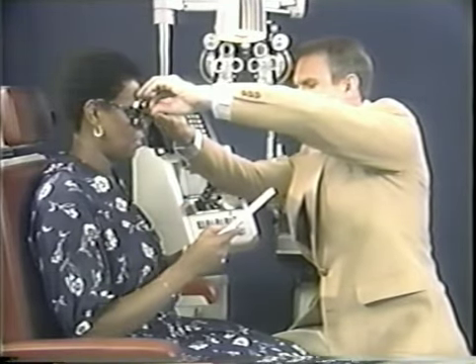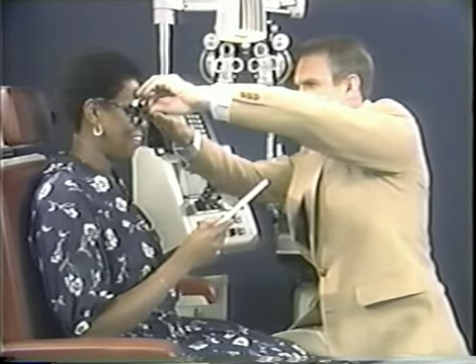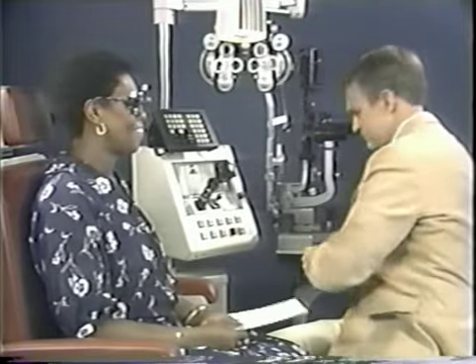It is important to resist the temptation to prescribe more plus power than the patient needs, for reading adds that are too strong are the most common cause of rejection of new glasses. When the final refraction is complete, the results should be recorded. A non-cycloplegic refraction is called a manifest refraction, usually abbreviated capital M.